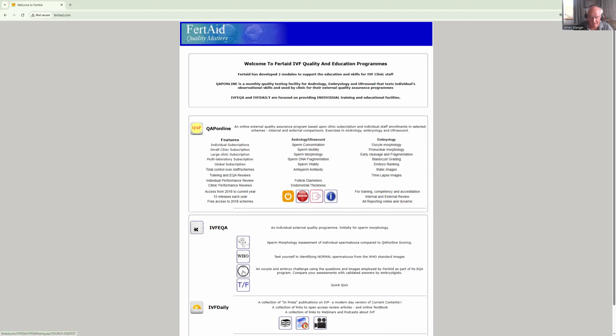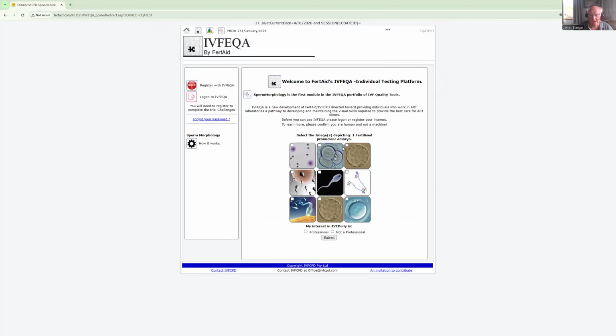But this one, which I'm going to do today, is actually looking at a whole lot of images of oocytes and embryos and asking you to answer a specific question on some part of how that gamete or the oocyte or embryo would be scored. And you can compare yourself to how everyone in my EQA program over the years has graded some embryo. So let's just click on this. Once again, you have to document yourself that you're not a spider.